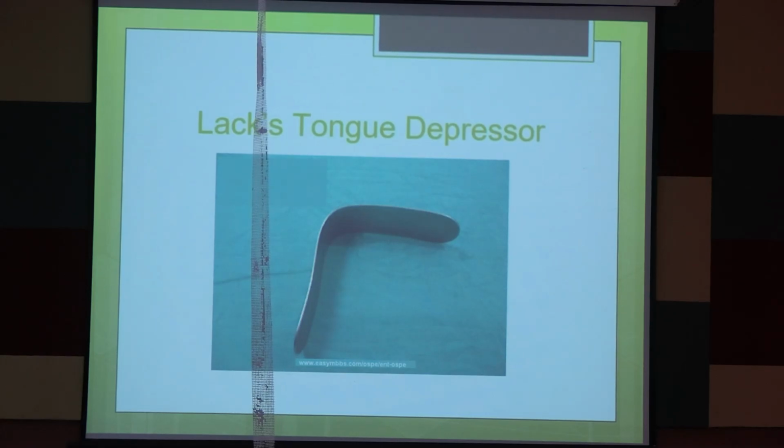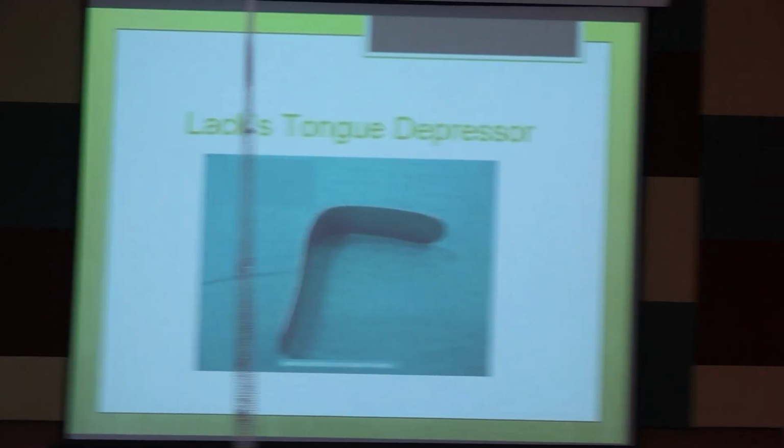So what are the uses of this tongue depressor? Use common sense. Diagnostic purpose. What diagnostic purpose? To examine the different parts, right? What are the parts? Oral vestibule. Next. Part of the tongue, oropharynx, tonsils, right? Palate, right? Floor of the mouth sometimes, okay? We can examine with that, okay? To examine the floor of the mouth you need a little technique, but we can examine it with that also, okay?